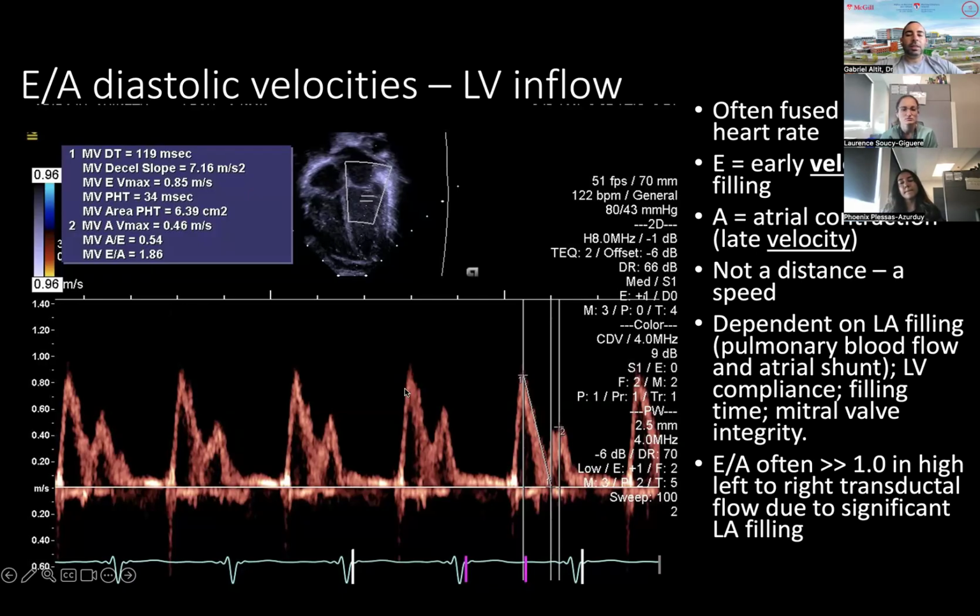And basically, typically, once you're a few days old or a week old, when you're done a big portion of your transitional physiology and your LV is now exposed to the systemic vascular resistances, the PDA has closed, and the LV is remodeling progressively to sustain the systemic circulation. Eventually, your LV will be quite compliant during diastole, and your early phase is when you get a lot of gush of blood flow in diastole. And so that's typically why you get a very rapid influx of blood, and your velocities in the early phase during the passive filling are much higher than your active atrial contraction.